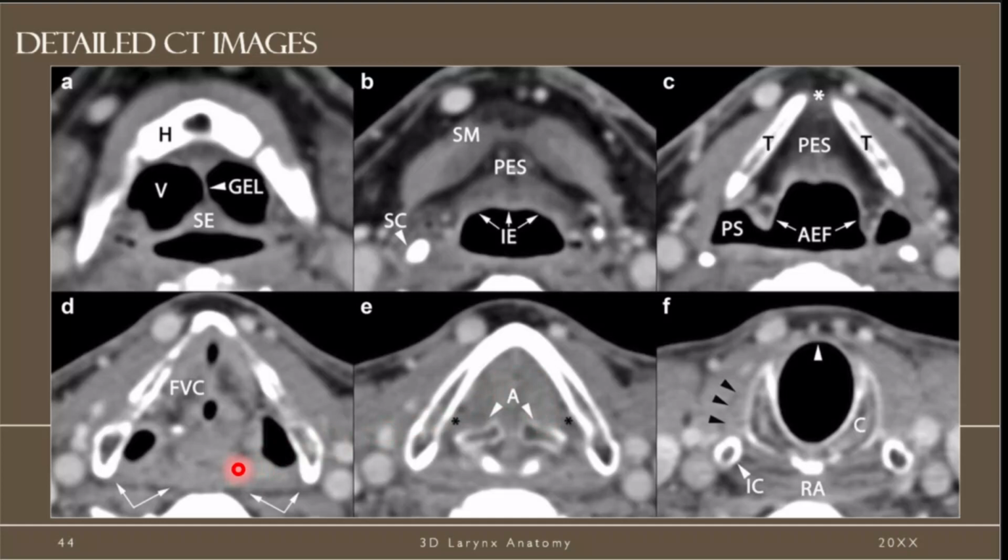Can we see the laryngeal ventricle in the axial images? No. You should search for it in the coronal or the sagittal images, because it does not appear in axial; it is very, very thin. We rely on the axial images on the arytenoid cartilage. This is the glottic level, supraglottic level. You see the hyoid bone, and then you see the cricoid cartilage. You are at the infraglottic level.